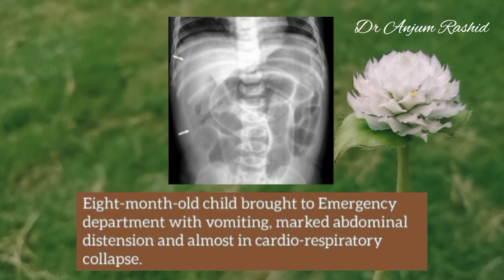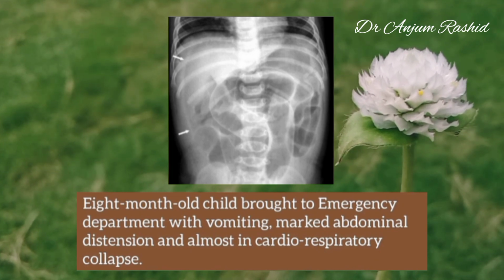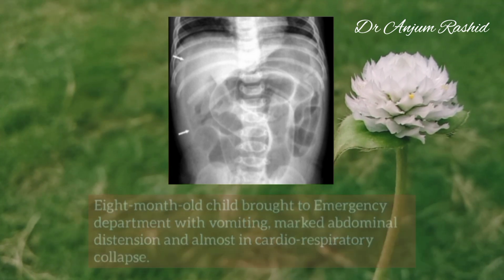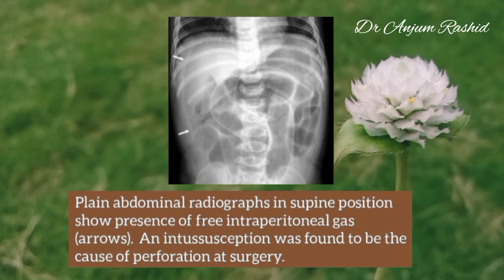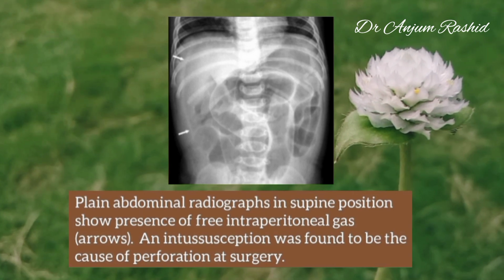Now, this is an 8-month-old child brought to the emergency department with vomiting, marked abdominal distension, and almost in cardiorespiratory collapse. Plain abdominal radiograph in supine position shows presence of free intraperitoneal gas, and intussusception was found to be the cause of perforation at the surgery.